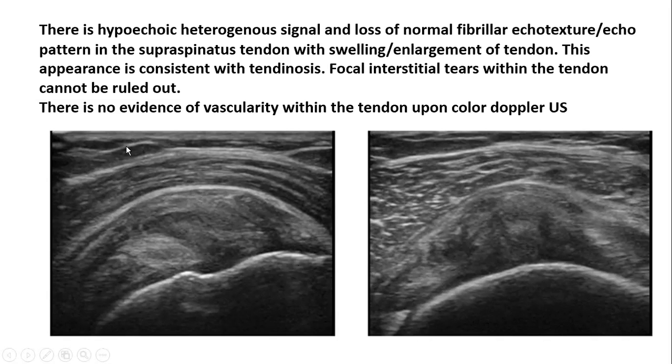But if you put the color Doppler, and you see vascularity here and here, then that's angiogenesis. You're seeing some blood vessels. This is not focal tear. Yes, I understand. So I'm just trying to say that it can be a complex picture where there are multiple findings, and you cannot define it black and white, tear and tendinosis. So Mohini, how would you differentiate a bursal thickening or herniation of the bursa compared to tendinosis where there is inflammation within the tendon? Because both look the same.